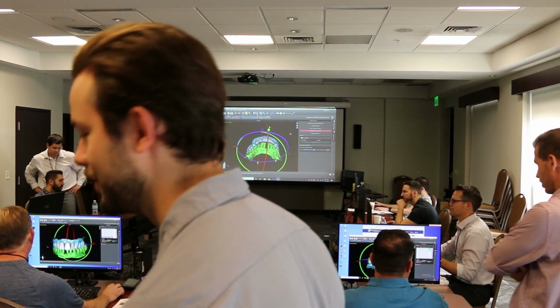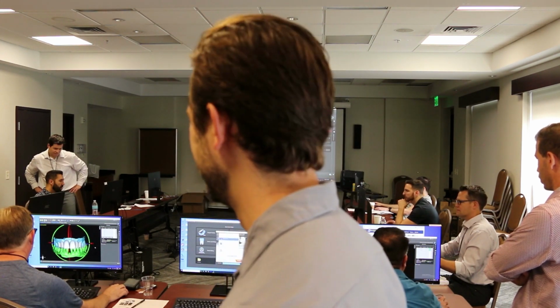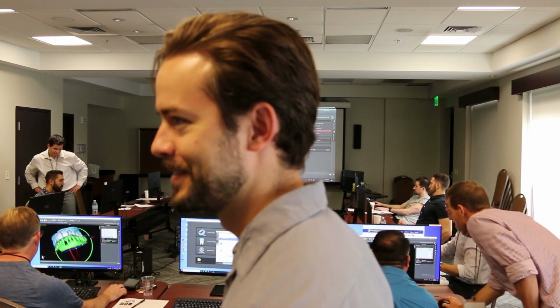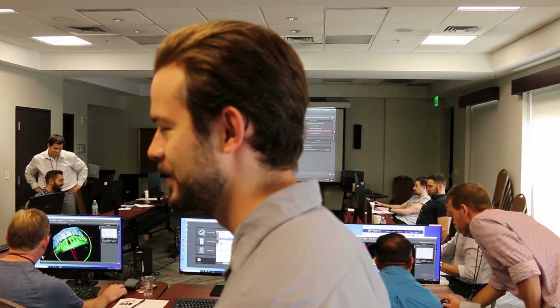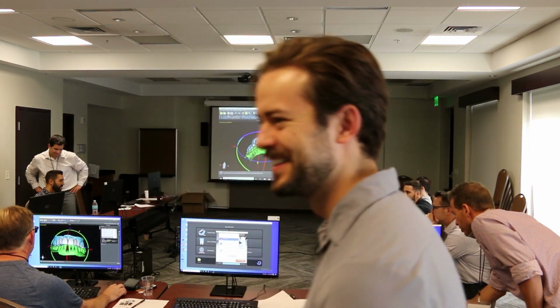Oh, nice. That looks good. You're close. So how do I affect the occlusion though? Yep, that's too much, overdid. I want to bring things in a little bit. How do you manipulate that? Yep. So if you look here, when you look, you go, oh wow, I'm way facial, right? And so this is where you're going to bring this back.